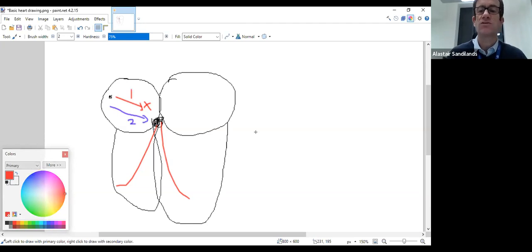Okay, so obviously imagine you've got a P wave, and the P wave does get through. The QRS is narrow because we know that the right and left bundles are okay. So in actual fact, you could probably do it like this. There's your P wave in purple. The first one doesn't get through, the AV node's not recovered. The second one gets through fine. And then your sinus node fires again. The P waves are always regular. Sinus node fires, AV node hasn't recovered, and it takes the second one again to come along. This one is okay. This one does conduct through.